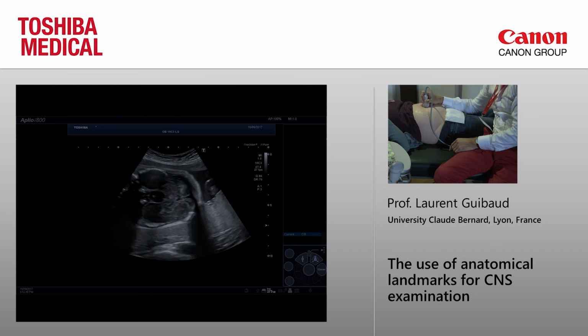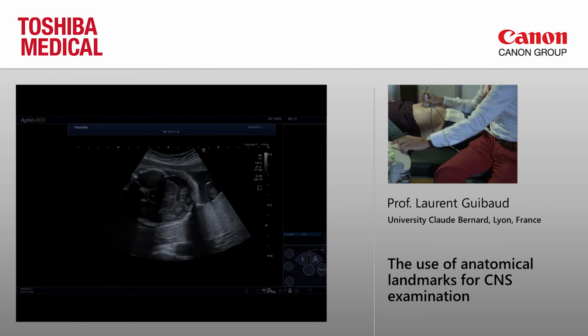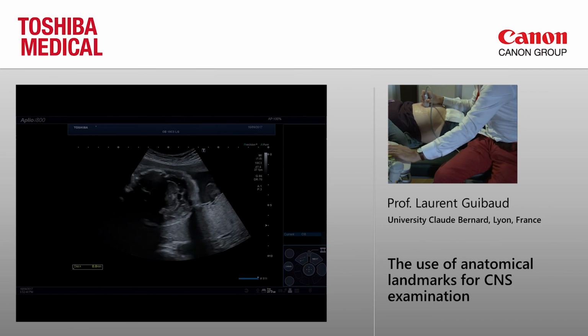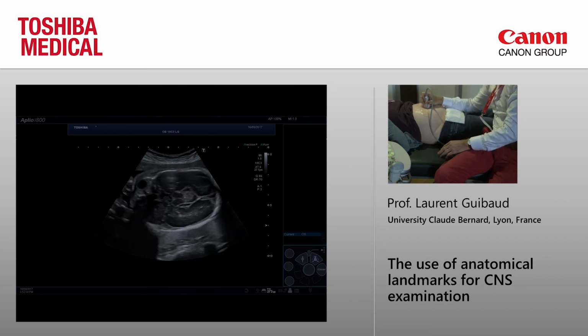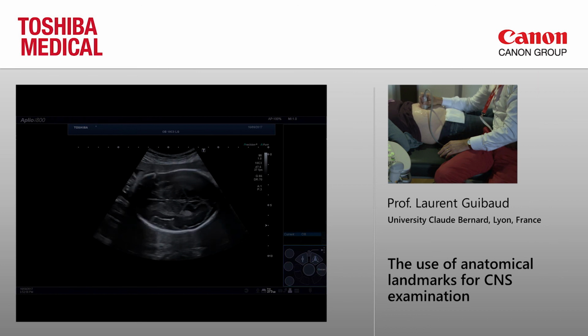There are some pathologies, especially in CMV infection. You have dysgenesis of the foliation, with foliation which is in fact not horizontal but vertical, and it leads to an irregular aspect of the border of the hemispheres.